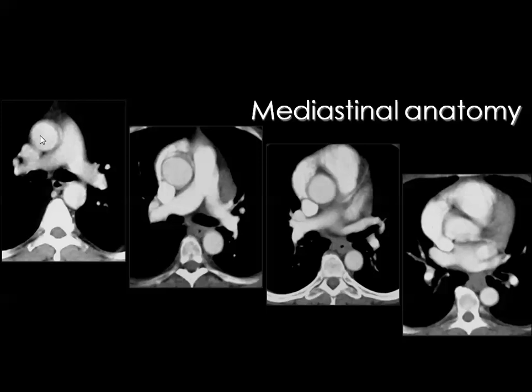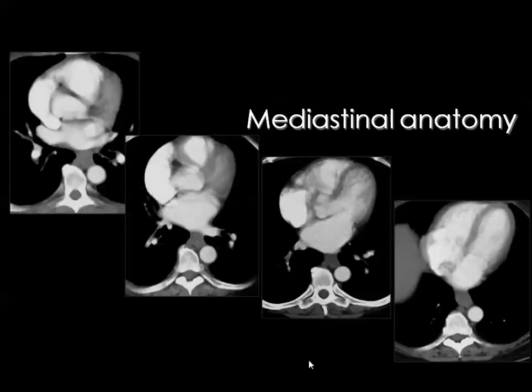The ascending aorta will enter the left ventricle, and this is the ascending aorta will enter here, and this is the left ventricle adjacent to the right ventricle, adjacent to the right atrium, and this is finally the left atrium, which is a midline cardiac chamber anterior to the spine. And here you can see the four chambers of the heart. This is the left atrium and right atrium. This is the right ventricle and left ventricle. And finally, you have reached the diaphragm and the dome of the liver.